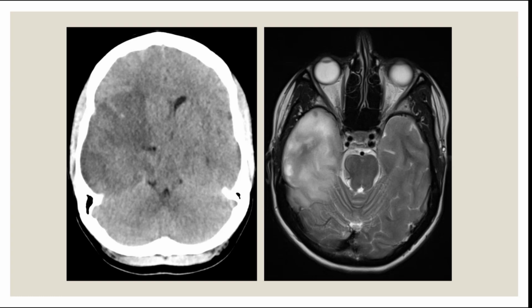The image to the right is an MRI. There is a somehow hyperintense lesion. It's more hyperintense compared to the surrounding. You can say that even if it's not really hyperintense to you, but compared to the rest of the brain tissue, it is more hyperintense. It looks somehow uniform, diffuse throughout the lesion. You can describe what you see with correct terms. And it's a T2 weighted sequence.